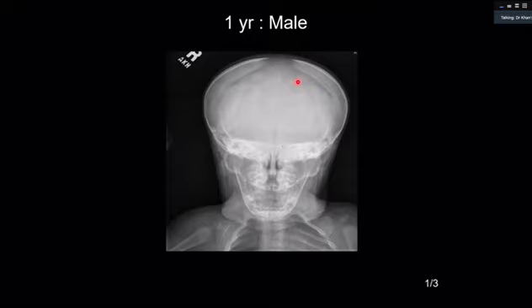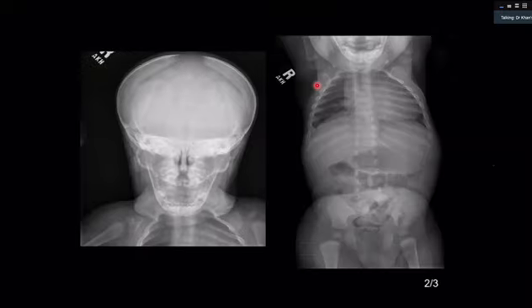The key in this case is to comment on the mandible, and that is the key exam point. And I will tell you why. Now, if you see the film of the abdomen and pelvis, look at the pubic symphysis, and there is widening of the pubic symphysis. Even look at the posterior elements of the vertebra. So this is the vertebral body, and this is not joined. And look at the ribs, these are short ribs. But these are all subtle findings. The main finding is this one.